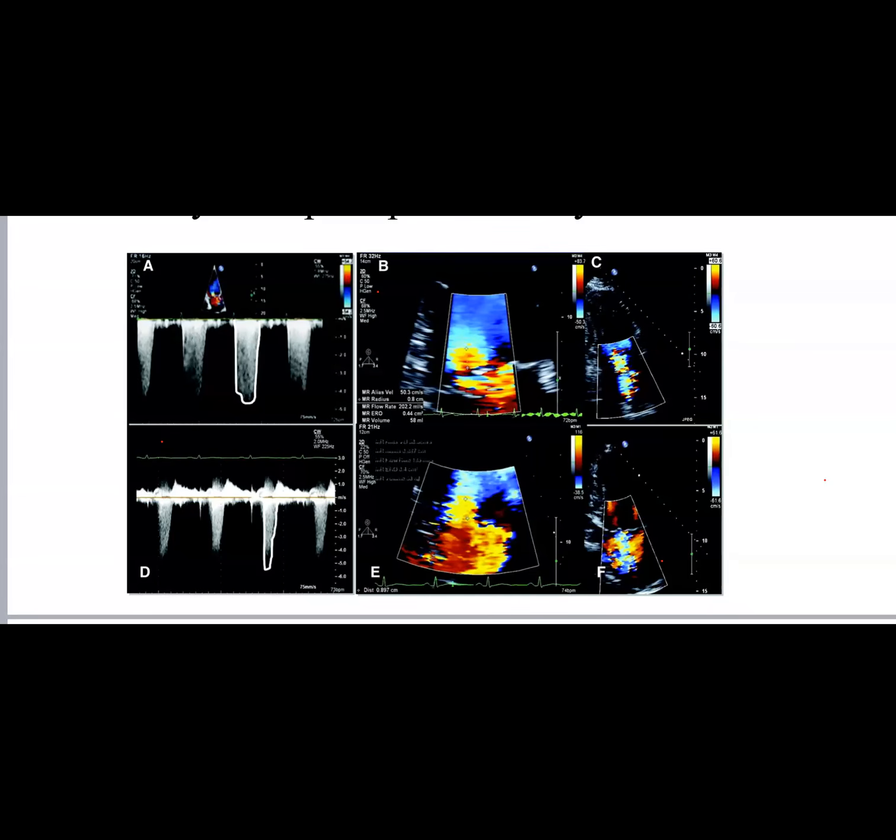But in prolapse, no. In early systole, there was no MR. The mid and late just started. So you are overestimating the MR if you use the vena contracta. That's why you better go volumetrically. You assess it by volume. The volume, yes. Okay.